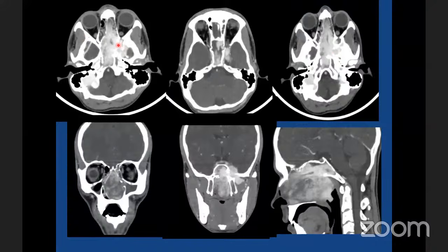Now, as a radiologist, your job is to identify where it has extended. Like in here, the nasopharynx, it has gone into the nasopharynx, reaching up to the anterior nares where it was seen. Here, unfortunately, this patient has an intracranial extension in the parasellar or medial temporal region, extra-axial, mind you. So the moment the lesion reaches this area, that is intracranial, things get a little complicated. They call it a red flag, because this patient may require radiation before treatment.